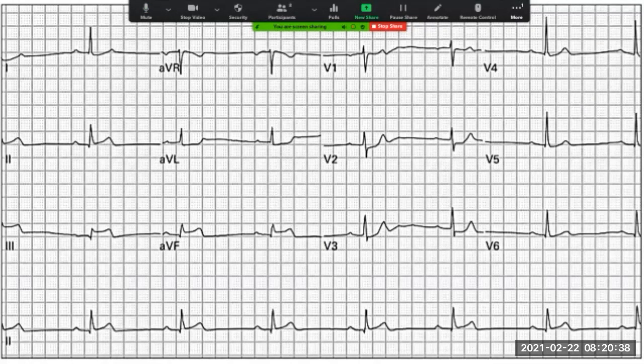Let's look at our P waves first. Can you see the arrow over there? Try to make it nice and big now. Hope it shows up okay. Just adjust this a little bit. Is that a bit clearer? That's a bit clearer, eh? Sorry, my eyes are not as good as they used to be. All right, so let's start.